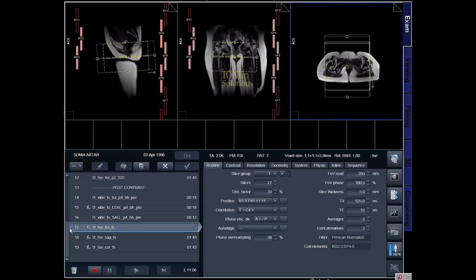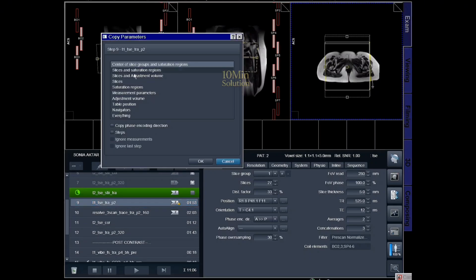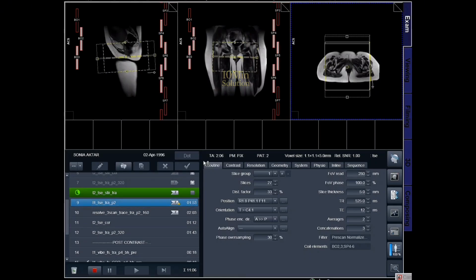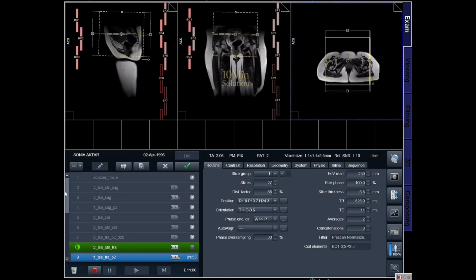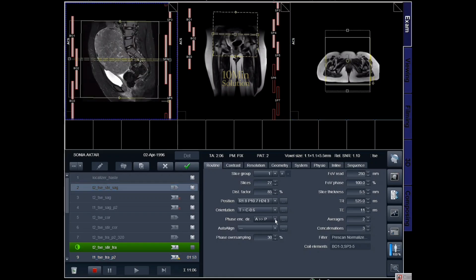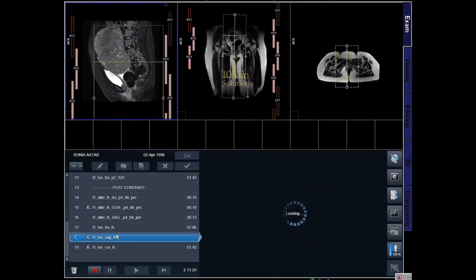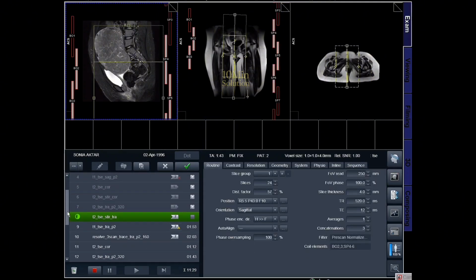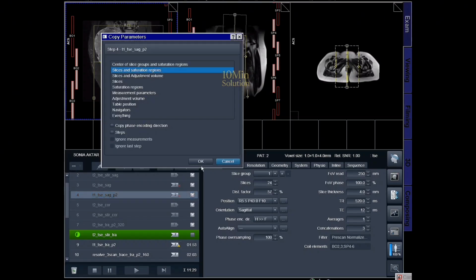Now the next plan, post contrast transverse planning. Just open the normal transverse protocol and just copy, and then apply. And now another is sagittal, the same way, just copy. Now I nicely set up, then apply. And now the next, look here. Same procedure.